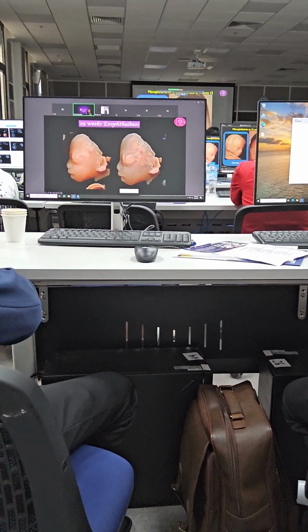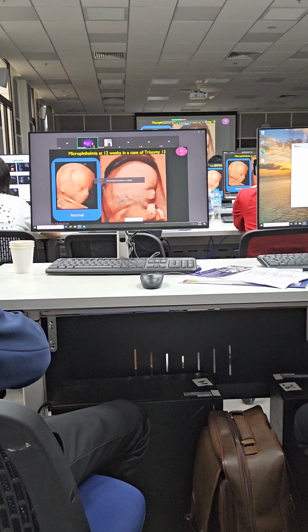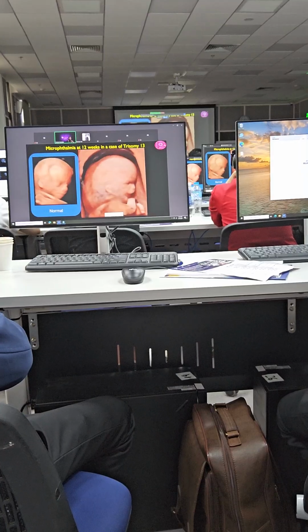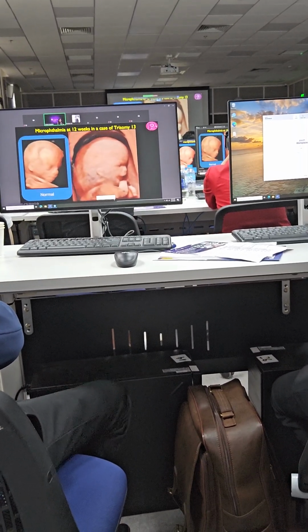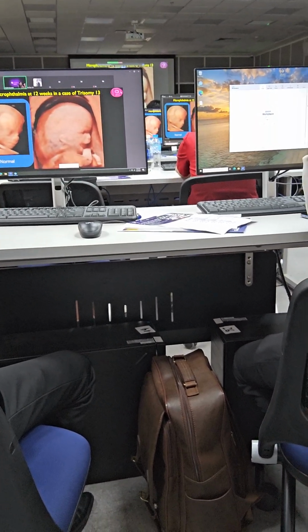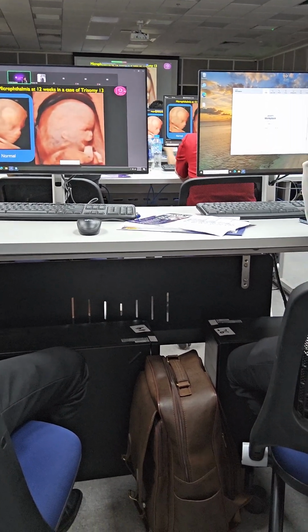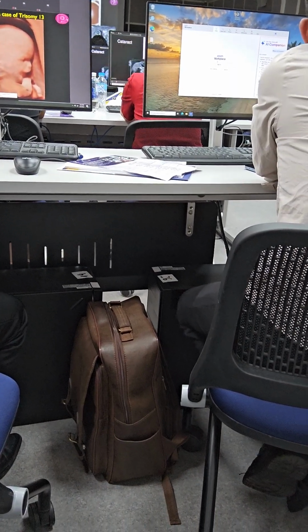Microphthalmia means the small eyeballs, and this is at 12 weeks in the case of trisomy 13. Okay? So many of the eyeball abnormalities, the exophthalmos or microphthalmia, and the other eye abnormalities are associated with abnormal brain structure.